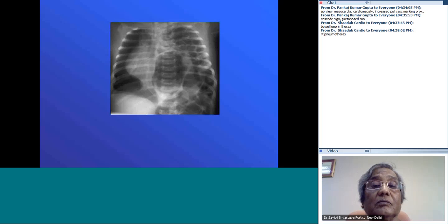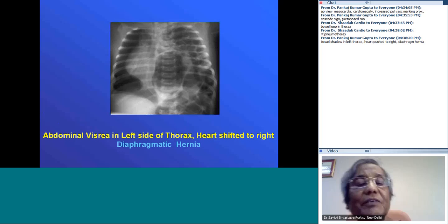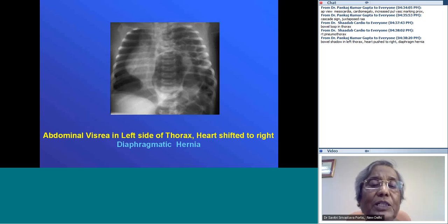Again, only one, but this is at least a different person who has tried to answer. But I think we have not tried to analyze it very nicely. This is a very, very typical X-ray. You see it today and try to remember it all your life.